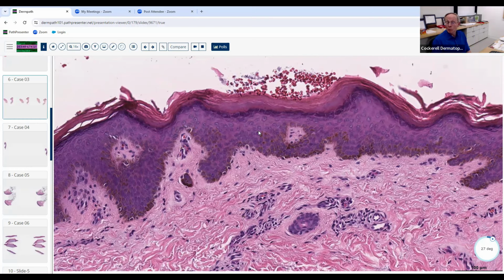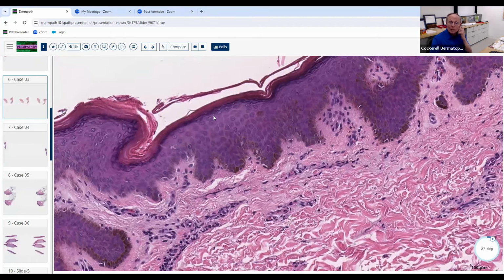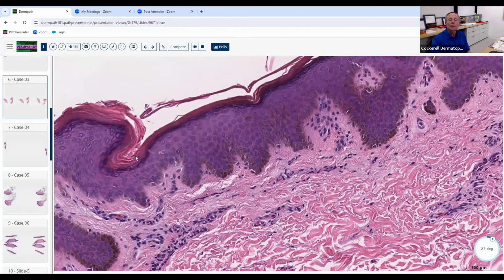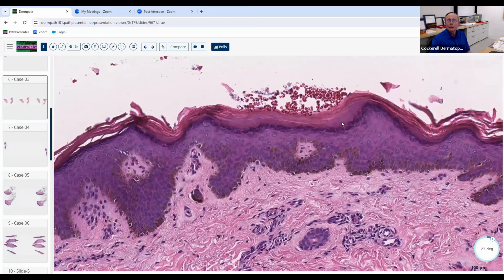Now, they would expect you to tell the difference between this and congenital bullous ichthyosiform erythroderma or epidermolytic hyperkeratosis. So you do need to know that reaction pattern, which is completely distinct from this. But you could look at this and say, this looks like it's consistent with one of the ichthyoses here. And that could be important because they might possibly show you something like this and might show you a clinical picture and ask you some questions about maybe the genetics of one of the ichthyoses or the biochemical abnormality that's associated with ichthyosis or one of those.